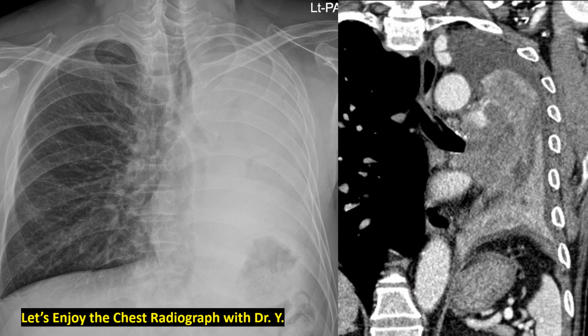This is the second case of squamous cell carcinoma. We remember this patient. We have seen him before. This is the left main bronchus. In the middle of the bronchus, there is a block. Something is blocking here, and there is left total collapse. In the coronal CT, there is a tumor blocking here, and this is all tumor, more than 7 cm, with collapse of the whole left lung, diaphragm elevation, and pleural effusion around the collapse. This is the usual shape of lung cancer.